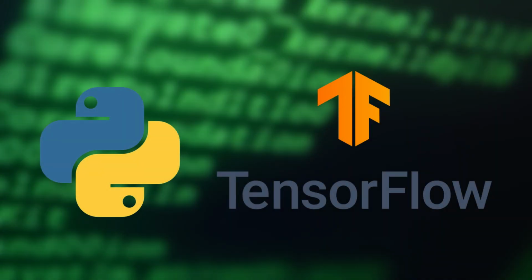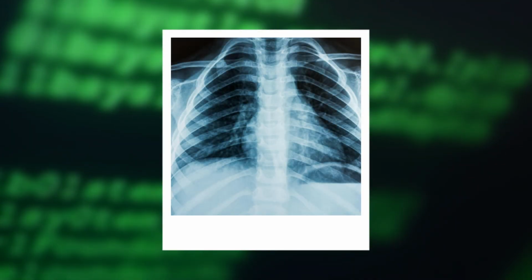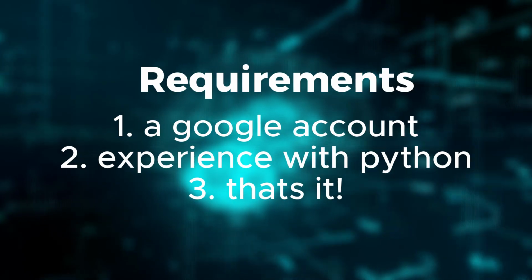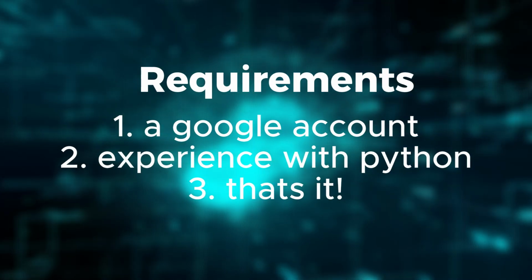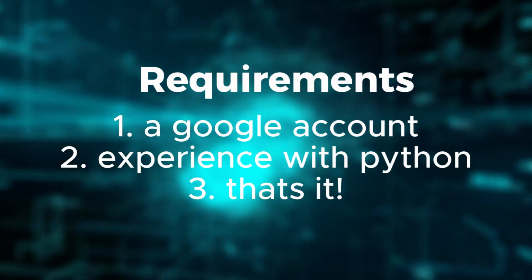But what if I told you, yes you, using Python and its corresponding frameworks, you were able to diagnose pneumonia at over 90% accuracy? So before we get started, here are some requirements. You need a Google account, experience in Python, and that's it. That's all you need to create an AI that's able to accurately diagnose pneumonia.